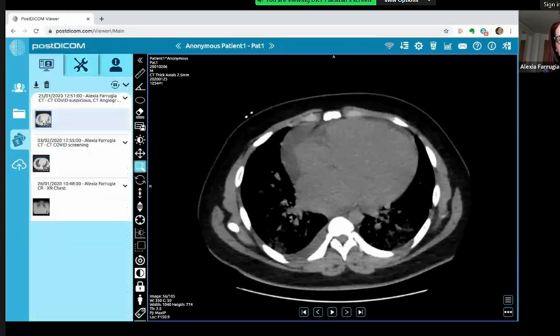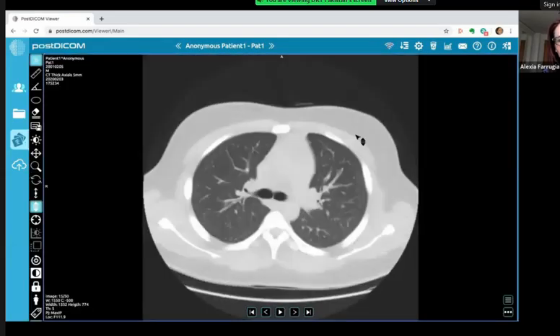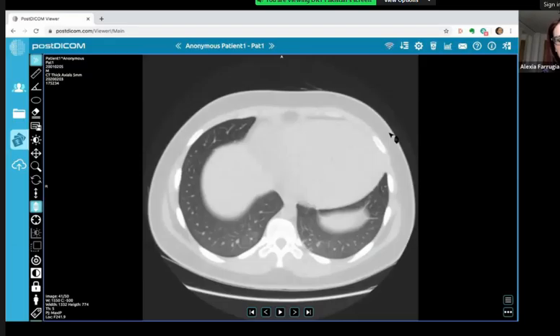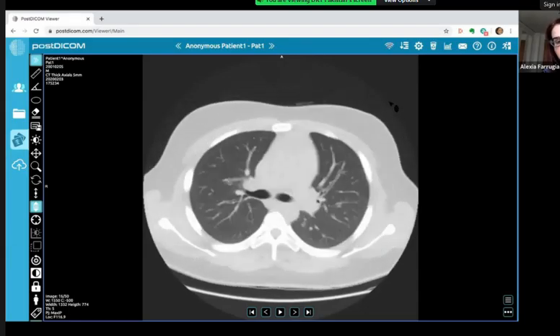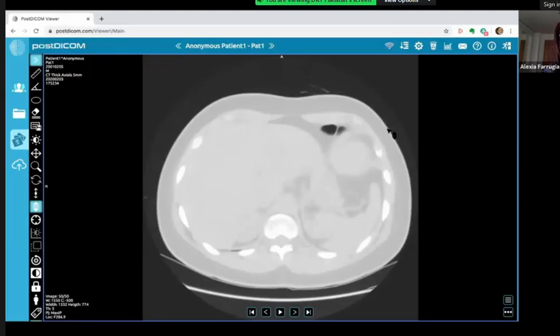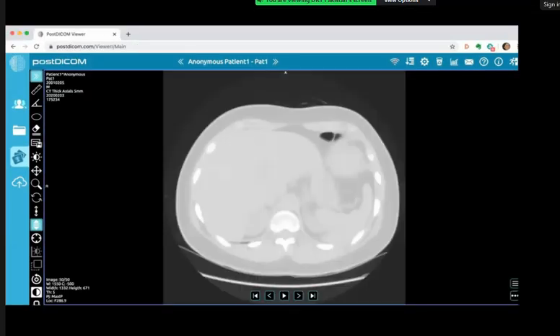Subsequently, he had another CT, which I'm going to show you. And on this, the pleural effusion has resolved. There's no fluid in the fissures. There's no edema. The heart is enlarged, obviously, but there are no residual lung changes after treatment. So that was the diagnosis for this chap. Thank you. And now he's being followed up by cardiology.